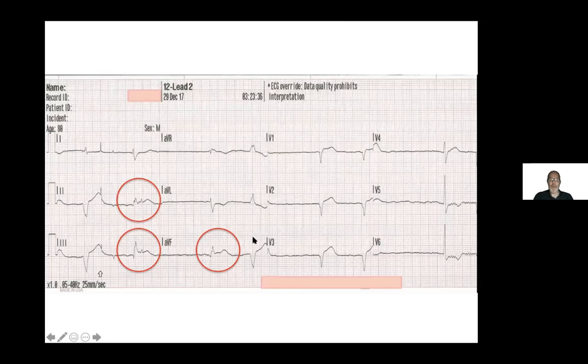He's bradycardic. These that you see right here are ventricular escape complexes. Here's a ventricular escape complex right here. Those aren't PVCs per se. They're coming from the ventricles, but they're actually escape complexes to try to compensate for this inherently slow rate. So he's bradycardic. He's not even in a sinus rhythm anymore. And you see some elevation in 2, 3, and AVF. Well, if you look a little closer, you look at that complex in lead 3 and measure the amount of elevation compared to lead 2. There's more elevation in lead 3 than there is in lead 2. And when you go to your money lead, there's some obvious ST depression in lead AVL. Look at this little complex up here in lead 1.